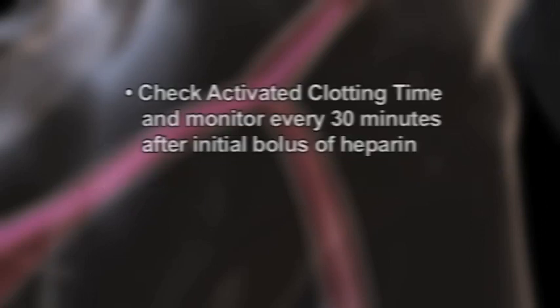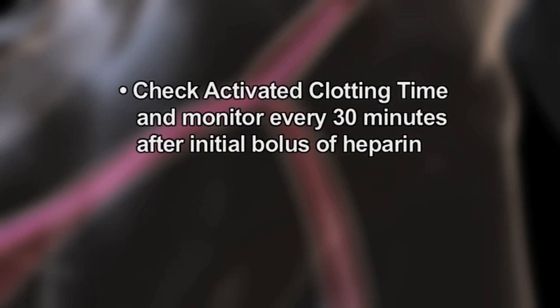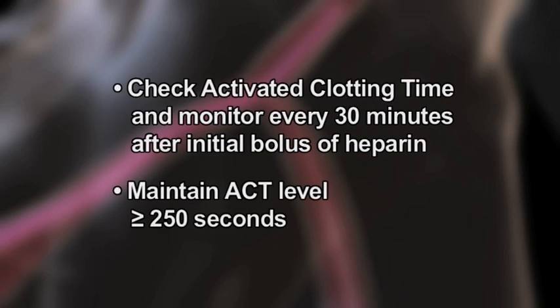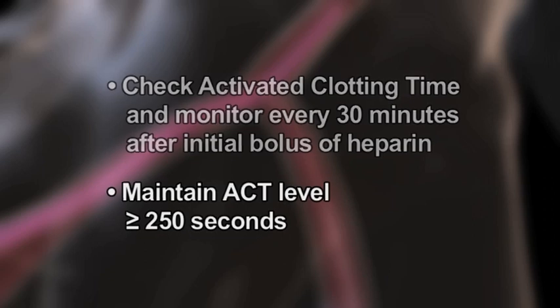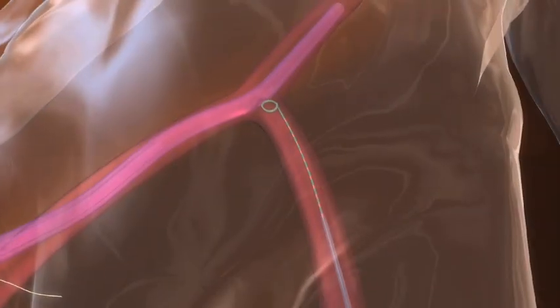If heparin is administered, check activated clotting time and monitor every 30 minutes after the initial bolus of heparin, and maintain ACT level greater than or equal to 250 seconds. Note, heparin may be administered at any time before, but avoid delaying beyond this point.